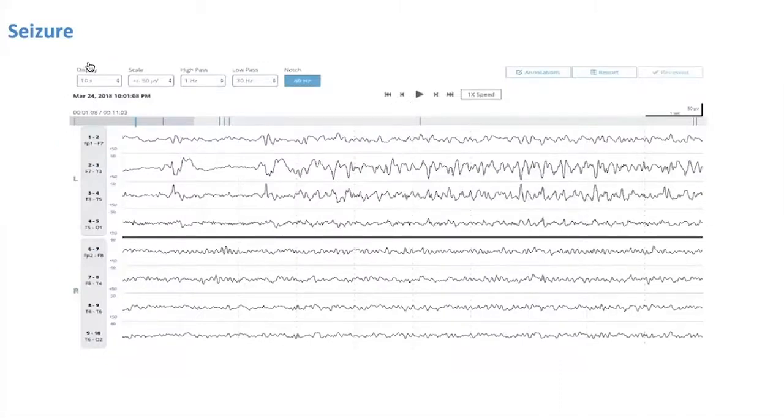Here we see a seizure that's progressing more quickly. You see how it starts off as one discharge in this first second, skips a second, you see another, and then it builds and it changes. And that's another feature of focal seizures in particular, this change over time. And by time, I mean 10 seconds, 30 seconds, that time scale.